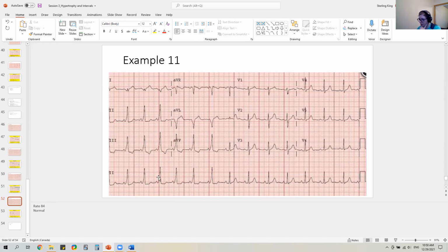P, QRS, T, P, QRS, T, P, QRS, T. And there's nothing dropped. So yeah, it looks like a sinus rhythm. Intervals. PR looks really short. It's almost at the same time. You can look at it: it's P and then the R is starting immediately after. So short PR. And that should be cueing something in us. If you're seeing a short PR, something is off. And this isn't a pacemaker running it, so it should be something to do with the person.